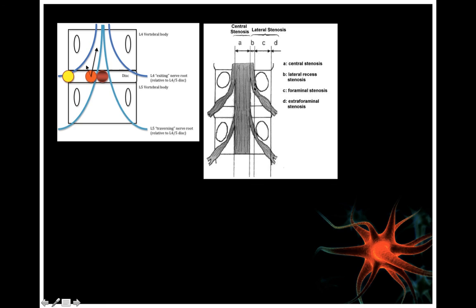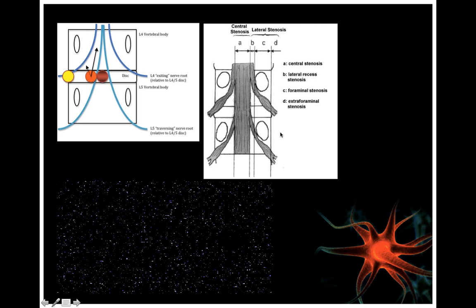And as you exit, you're out of the highway. You're actually in the exit, making the turn. This is the foramen, and we talked about the foramen becoming narrowed, right? So that's called foraminal stenosis. Once you're out of the foramen, outside the spinal canal and the entire vertebral body, it's called extraforaminal region or lateral region, okay?